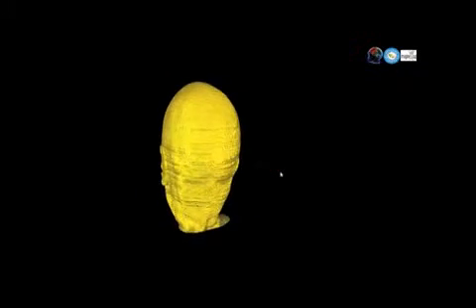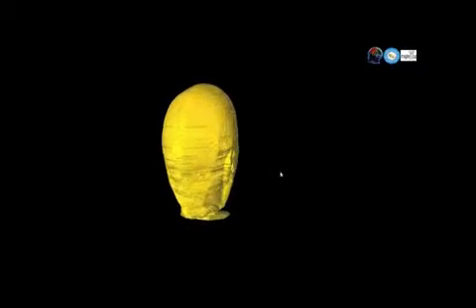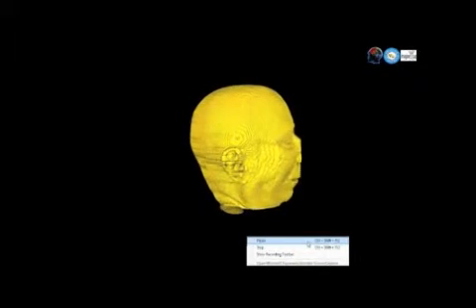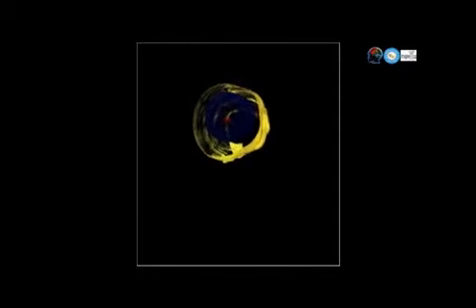It gives a face model of the patient such that you can even recognize a person using this model. The user can zoom it to get a closer look at the subject, and can rotate it at any angle along any axis to get a better view. We can use it to correctly locate and see the size of the tumor and even rotate the image in various directions. It is user-friendly and one can easily use it.